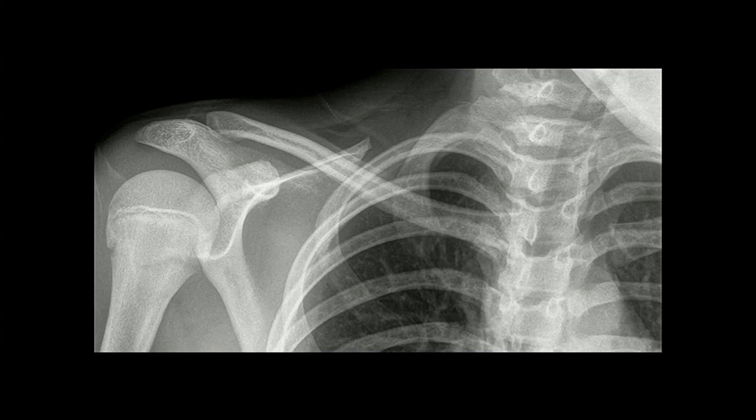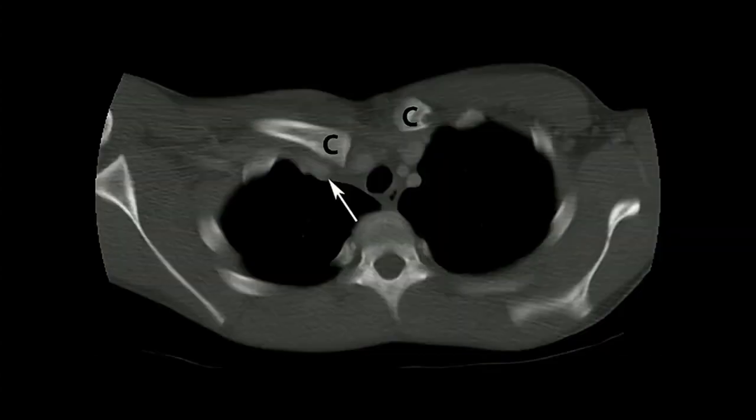So going back to the radiograph, this is important to really be critical because oftentimes this is the first imaging, which it should be, but it may not progress on to higher level imaging, which it should, unless you, the radiologist, point it out. So it's subtle, but there's a little bit of offset in the positioning of the clavicular heads. And sometimes it's hard to make that decision. It could be poor positioning, they could be awkwardly placed. You just don't know sometimes, but CT really is going to be definitive.